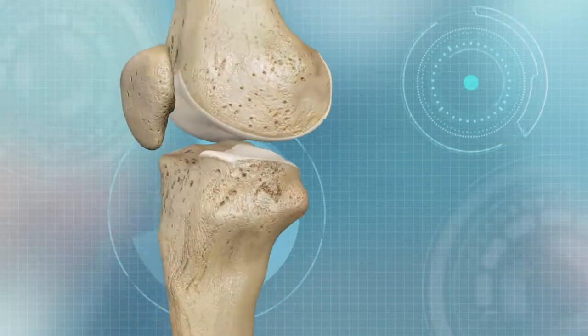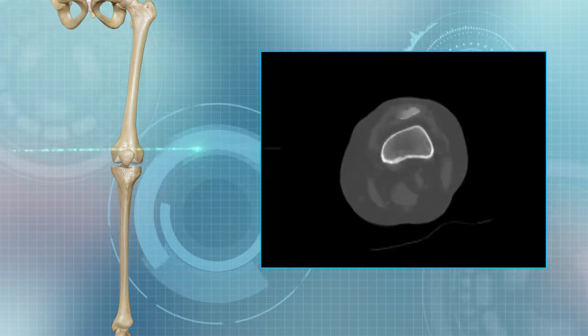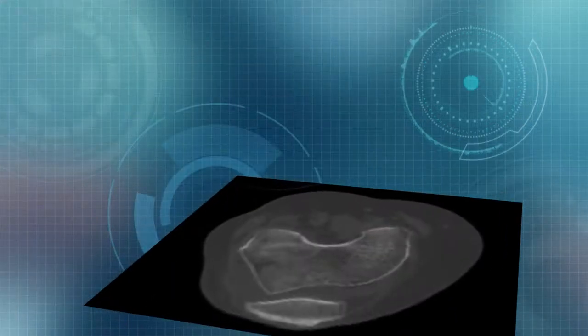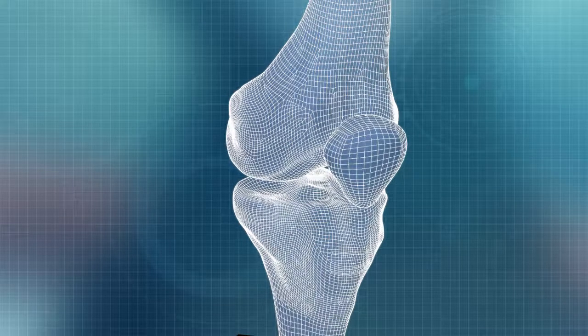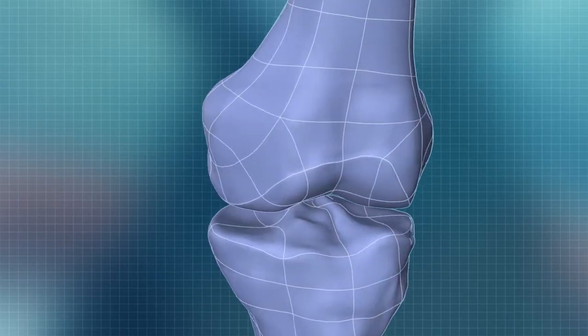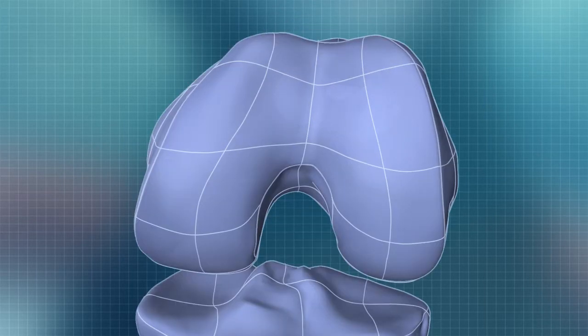The Conformis process starts with a patient CT scan through the hip, through the affected knee and ankle. The proprietary iFit software converts the two-dimensional CT data into a three-dimensional model that replicates that patient's unique anatomical bone geometry. In the 3D environment, iFit recreates the patient's natural J-curves, corrected for deformity.